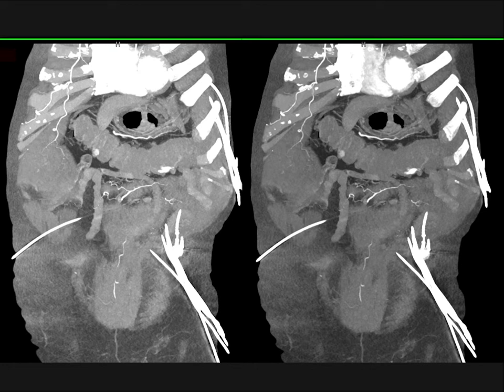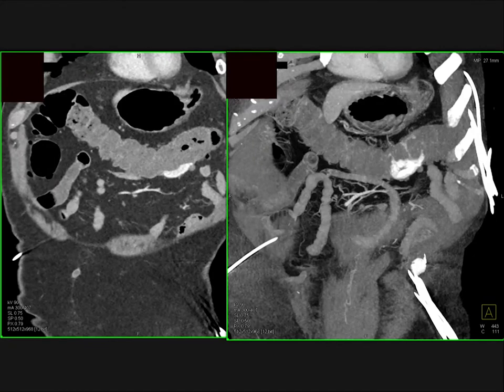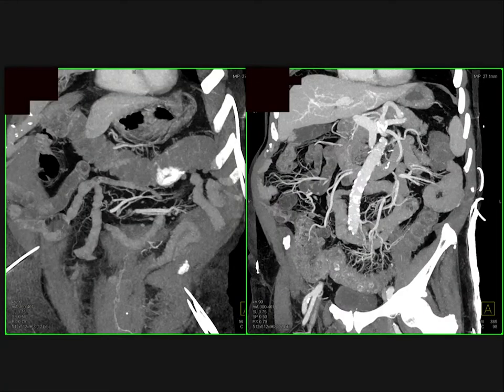Just a really nice example. This shows you also some of the imaging, MIP very nicely showing you the bleeding. There's also another focus of enhancement in the proximal transverse colon. And look as you go from arterial to venous, look how much more extensive that bleed is. We have no doubt it's active bleeding truly from the first images, but the change from arterial to venous is classic. And those are the patients who will typically have findings of positive angiography.